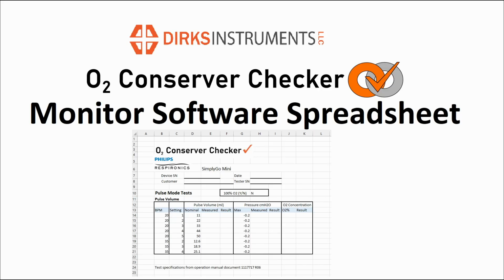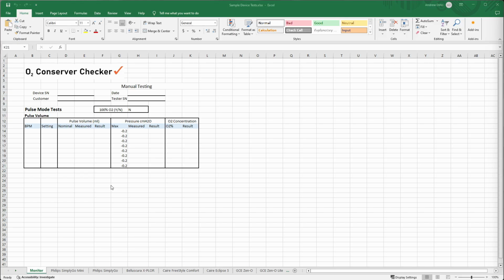In this video, we will look at how to update and modify the Excel sheet used to generate the device tests for the monitor software. On this first tab here, we have the basic monitor function. This does not include any tests and allows us to have the device test document open while not displaying any pass-fail criteria. Along the bottom, we have all of the units that we want to use for testing.